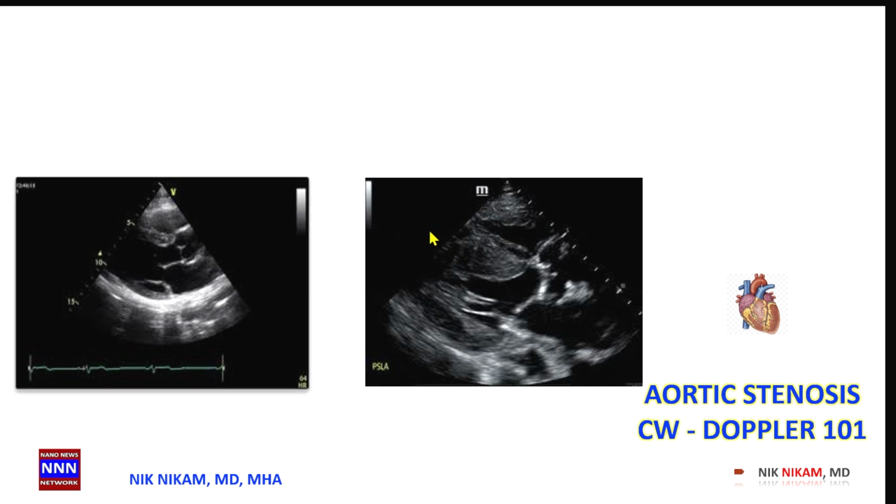So let's continue with some of the important clinical features which account for those wave changes that we see in patients with aortic stenosis. A patient with critical aortic stenosis may have thickening of the aortic valves, sclerosis, and there may be calcifications and nodules, and there may also be some aortic regurgitation. There may be dilatation of the aortic root and the ascending aorta. There may also be associated left ventricular hypertrophy. Along with that, there could also be diastolic dysfunction of the heart function, which will be evident from the Doppler studies across the mitral valve. So we're going to focus on the aortic valve here.